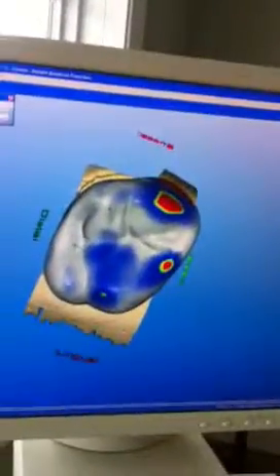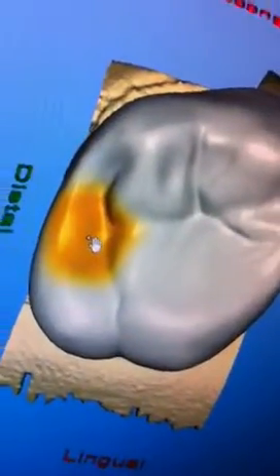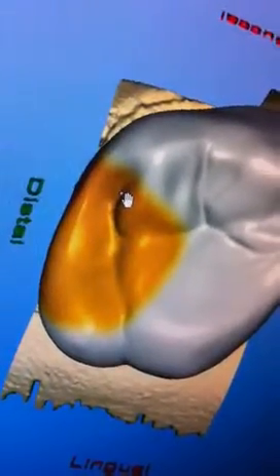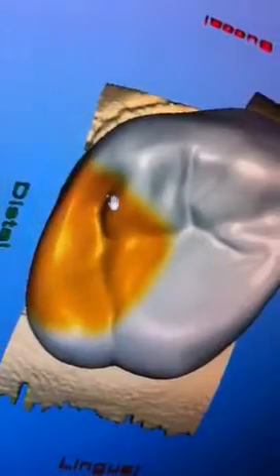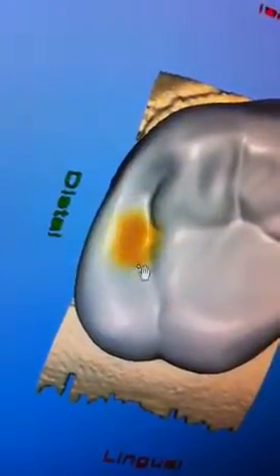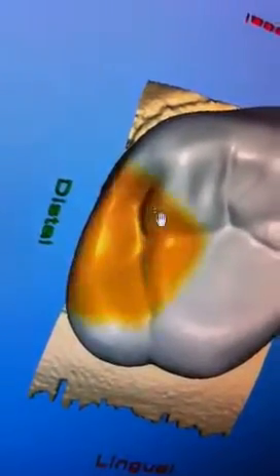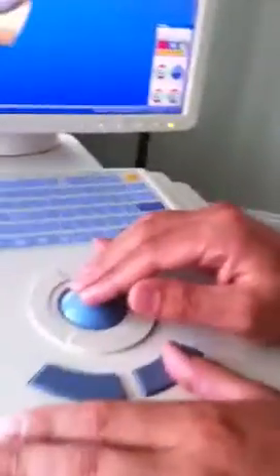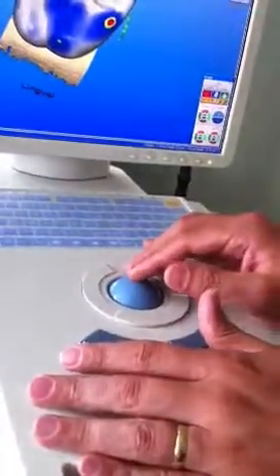Another way to adjust the scale of how much material is going to be manipulated, you can actually put your hand on any part of the tooth and hold down the right click, and if you want to take more material, move the ball up. Oh, that's a good feature. As you can see, while I'm doing that, you can put your camera over here. So the yellow is what I'm able to manipulate. Right, and you move down, and it coordinates with this scale. You can see the white line go up and down. Yeah, I see. Whenever I move the ball. True. All right.